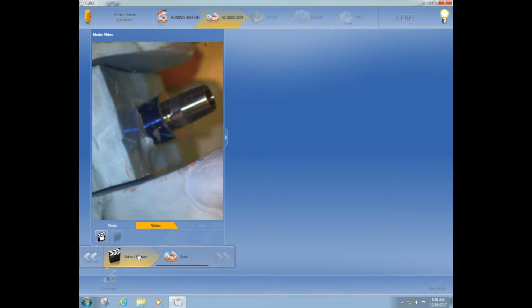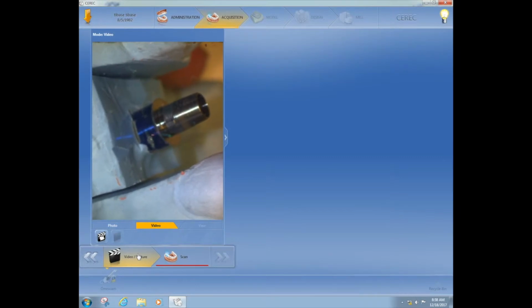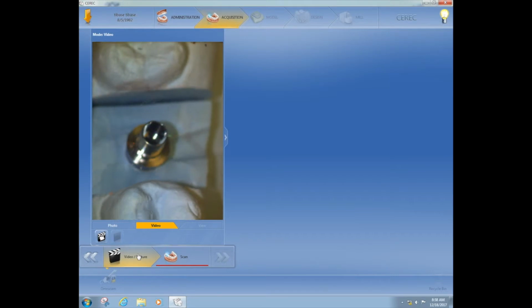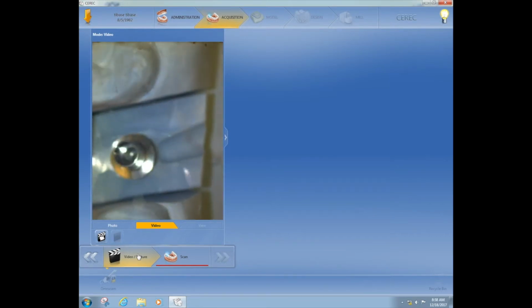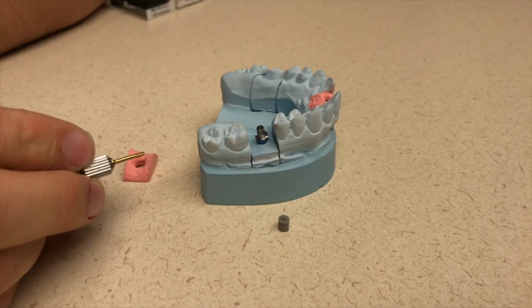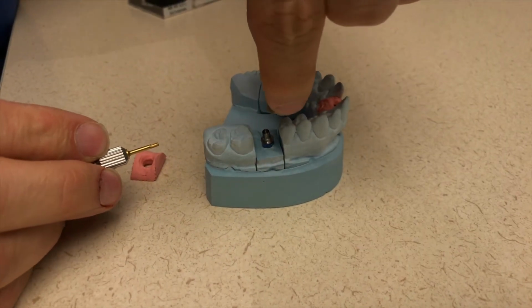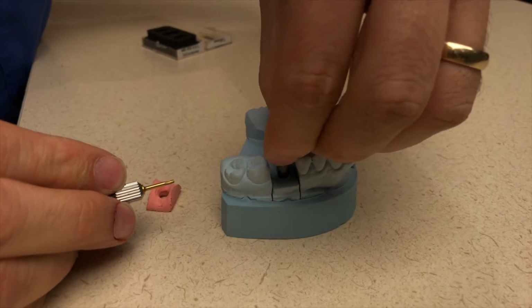If you were to do this intraorally with the scan post, you would then have to take a radiograph and confirm it's seated, because obviously the patient's gingiva is in the way. But now that I removed the tissue moulage, you can see that it's fully seated. Now I'm going to grab the scan body and place that on there. The OmniCam scan bodies have gray and white caps, and I'm going to marry those up so they're correct.